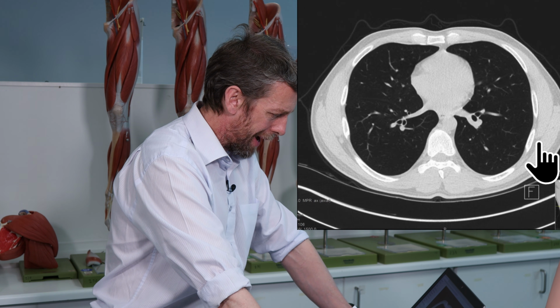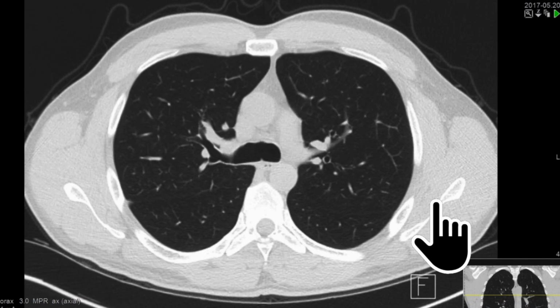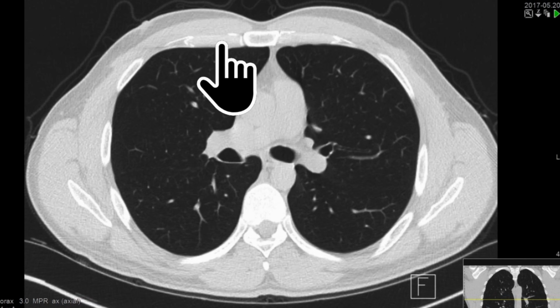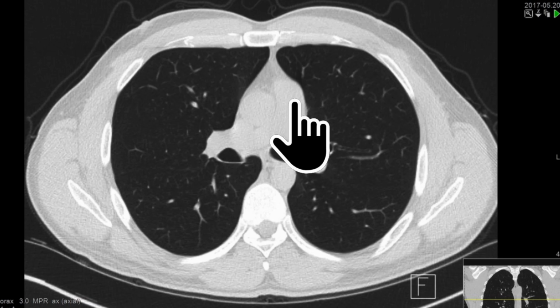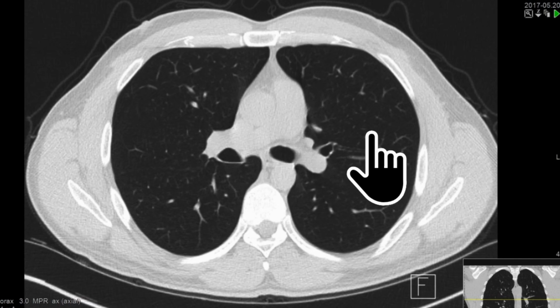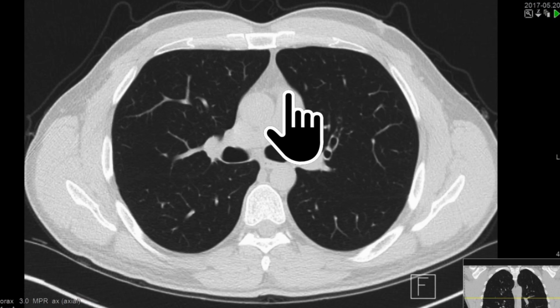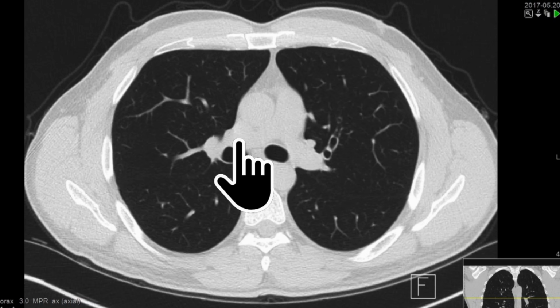So if I scroll back up, can you see the thing that's happening there? So this is anterior. This is the thing that's happening here. This is the shape, the Y, that I look out for. Sometimes it's quite a bit more distinct on MR, but this here and this CT could have a bit more contrast even. But this here, this Y shape, yeah, do you see that?